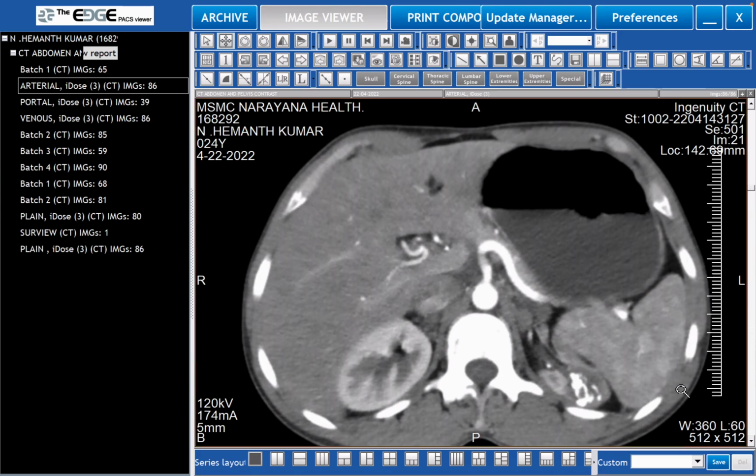Hold on. You cannot use terms loosely. Can you see the excretion of contrast here? No, sir. No excretion. What is the first thing you should ask for when you're given this CT? The delayed film. So first we will ask for the non-contrast film. So you can't wait for me to tell you that. Yes. So can we have the non-contrast film?